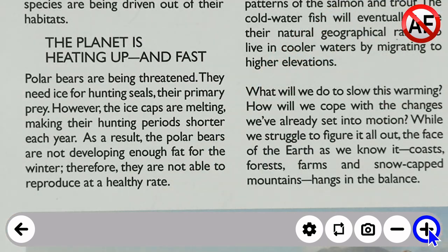So autofocus is very good for documents or items that are going to be at the same level all of the time, or in some cases for three-dimensional objects so that you can get focused in at one level of that object and lock in there. It's also good to use in situations where you're going to be writing or doing things with your hands underneath, so the camera is not always trying to focus. So again, autofocus lock is on right now.